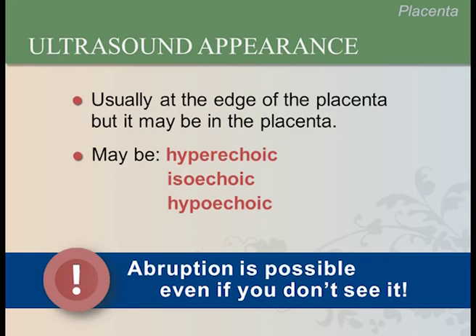However, if you see ultrasound evidence of abruption, this is associated with worse outcomes for the mother and baby. Remember, abruption is possible even if you don't see it.